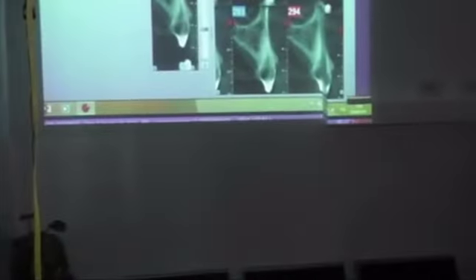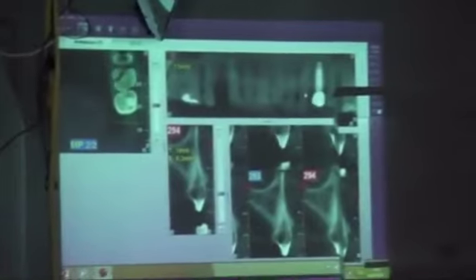In this case you don't have 3D because the computers don't support 3D. But you can see 3D, you can see everything. Now I show. It's very important. This is a case. Check the inclination of canine in maxilla.